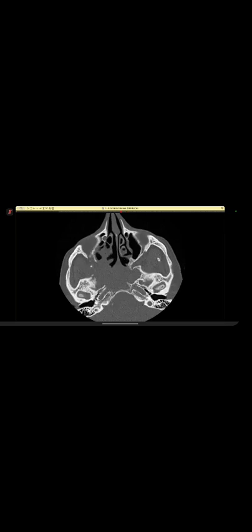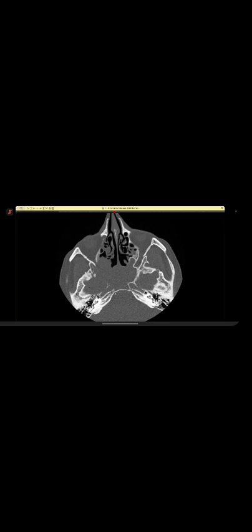So what do you think is the epicenter of the lesion? Sir, it is in the clivus, midline in the clivus, posterior at the level of the sphenoid bone. What is the structure anterior to the clivus normally? Sir, sella and sellar region, sir.